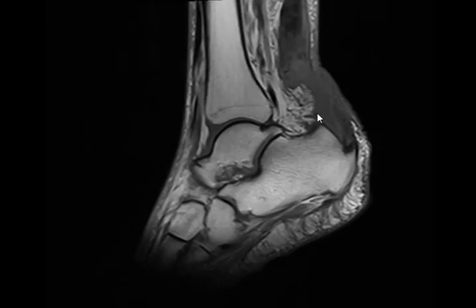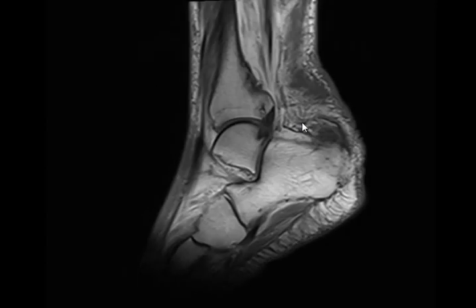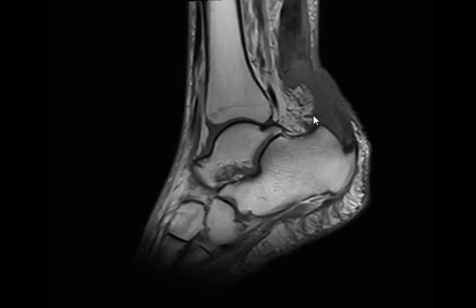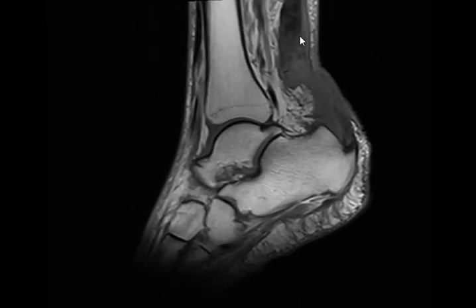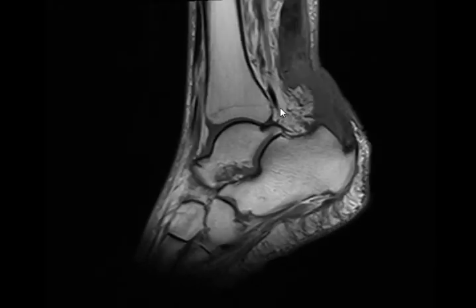The important thing here to mention is what? The surgeon needs what of you? Well, the surgeon needs you to mention the distance of retraction, the gap. How much is the gap? You just, wait, don't leave the mouse. You just measure the distance from here to here. How much is it retracted? So he can know how much traction he needs to apply and the technical surgical approach.